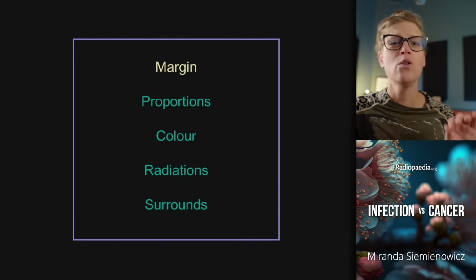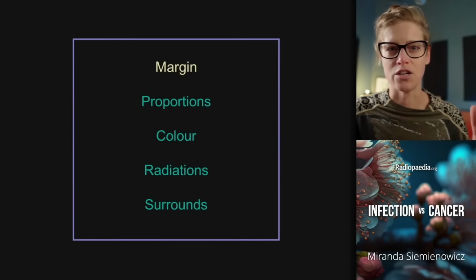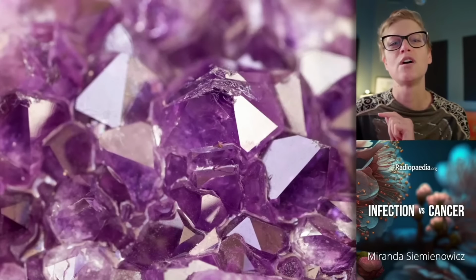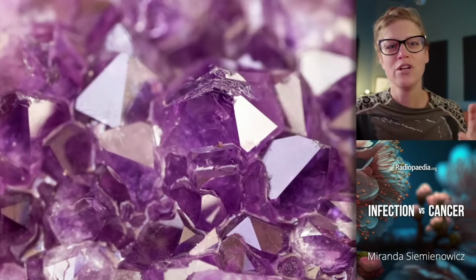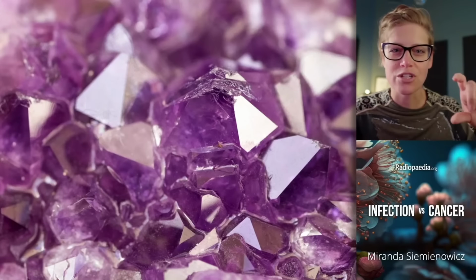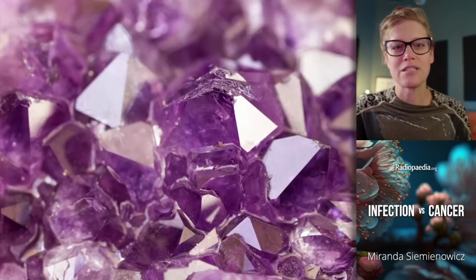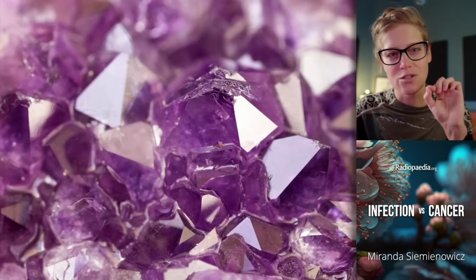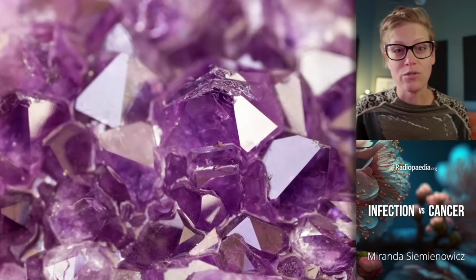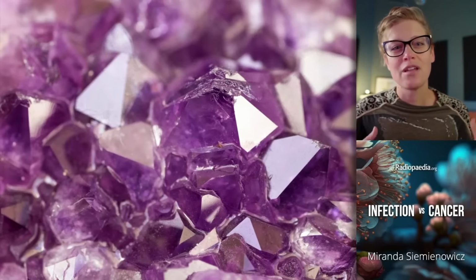When we talk about lesion margin, what we're looking for is evidence of that normal background lung parenchymal architecture. We're looking for the features that show us that the lung is in charge, that the architecture is preserved, and what we're looking for is that secondary pulmonary lobule. So you all learnt about it, you thought you'd never have to think about it again, but it's that 1 to 2.5 centimetre polygonal structure that is a 3D tessellation throughout the entire lung volume, bounded by interlobular septations, and at the centre of which is the terminal bronchiole, a branch of the pulmonary artery, and this fills the whole lung parenchymal volume. It's identifiable by its typical polygonal appearance, often hexagonal in structure, and we look for that when we're interpreting these lesions.